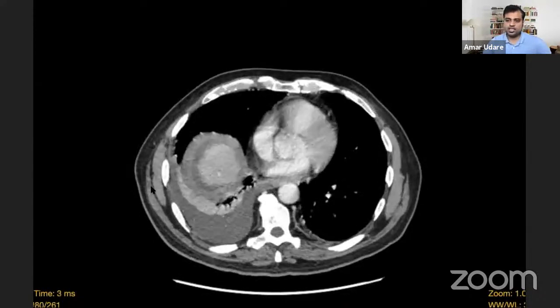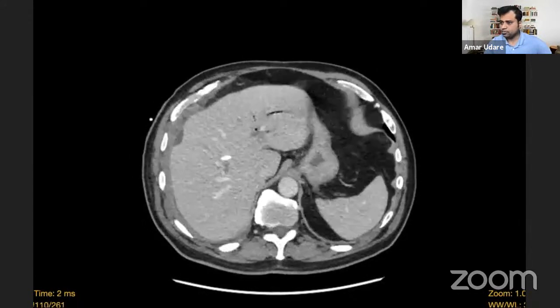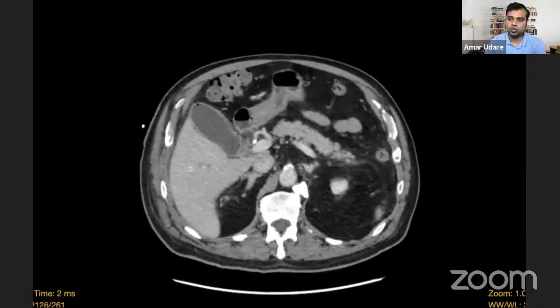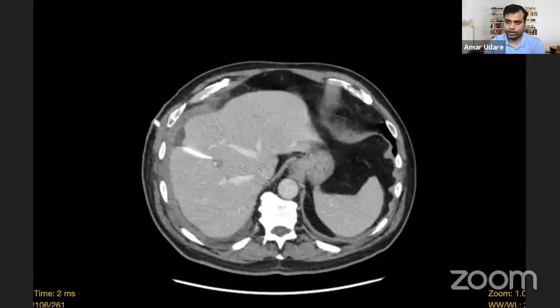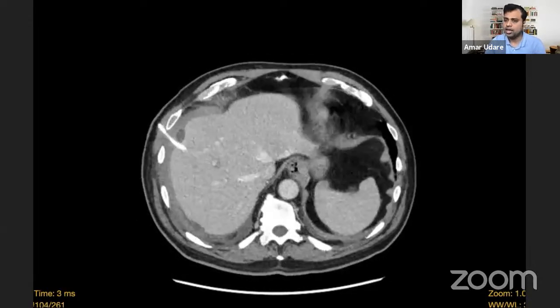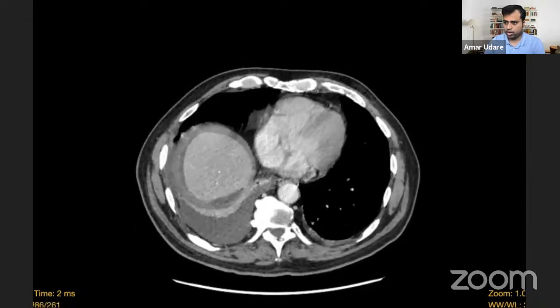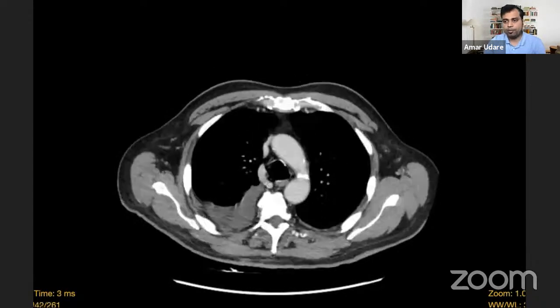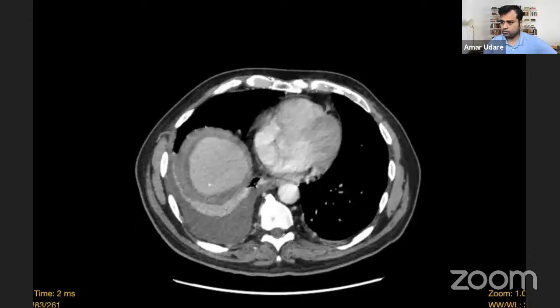This patient had a periampullary lesion, and they underwent PTBD a week ago, and then presented with right-sided chest pain. A radiograph and an ultrasound showed some effusion, and the CT was done following that. So let's go over the images. The pre-PTBD study did not have any effusion.